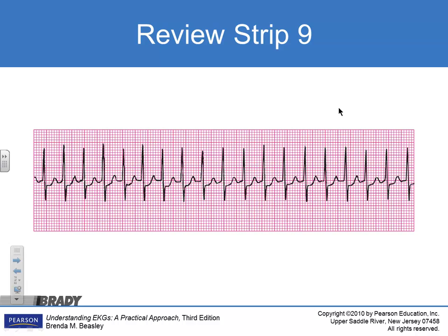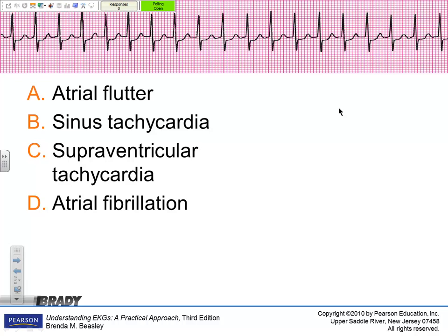All right, what's this? Everybody voted it.